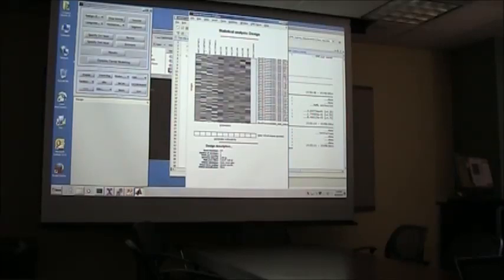So you have these four columns, and then you have columns for your motion parameters, which you also enter. So this will be your full model for this subject.